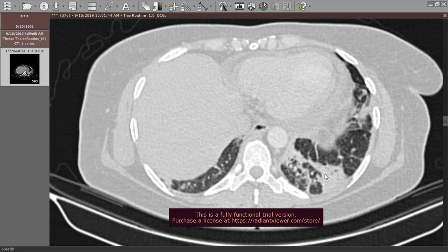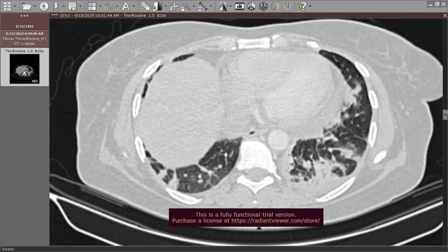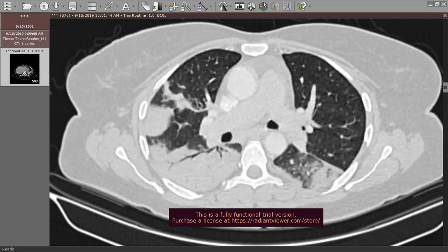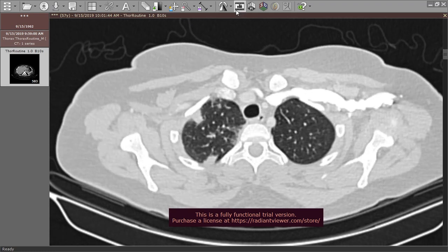This means that this consolidation is accompanied by atelectasis. It's called consolidation atelectasis, and it represents either an actual, true recent infection, or maybe a sequel of previous infection or old infection. So this consolidation with the smooth air bronchogram is typical for pneumonic patches. Bacterial pneumonia, yes.